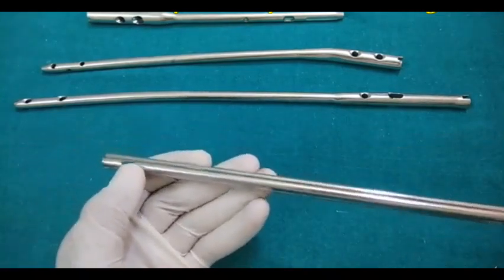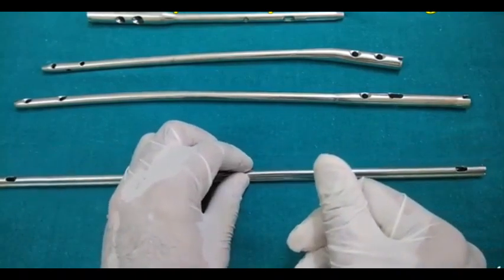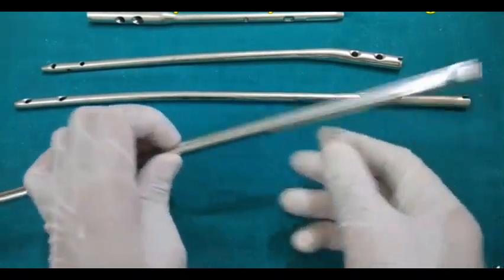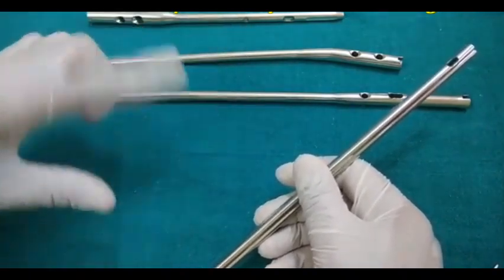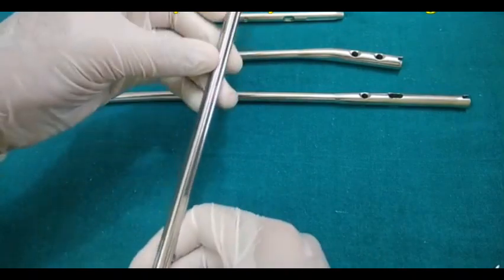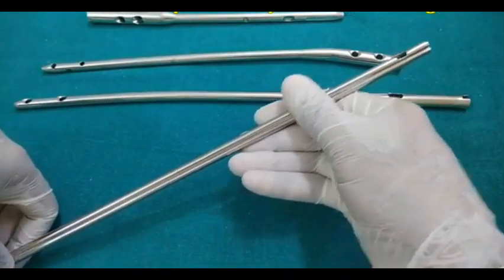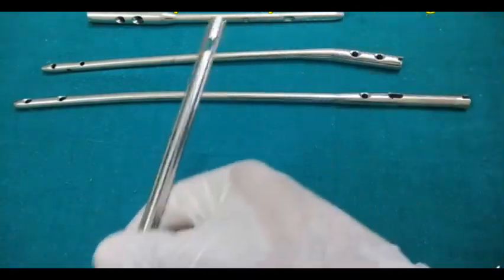What is the purpose of this eye? So I will tell you, because this nail was originally devised for retrograde nailing. So retrograde nailing was, you open the fracture site, you freshen the fracture ends, and you insert it retrogradely. So for example, if there is a femur fracture, you open the fracture site, you take the 2 fragments. In the proximal fragment, you insert this, and once it is out of the greater trochanter, you reduce the fracture and then you insert it in the distal fragment. So this is the way you do the retrograde nailing of the femoral fractures. So it is when you are going in the proximal fragment.